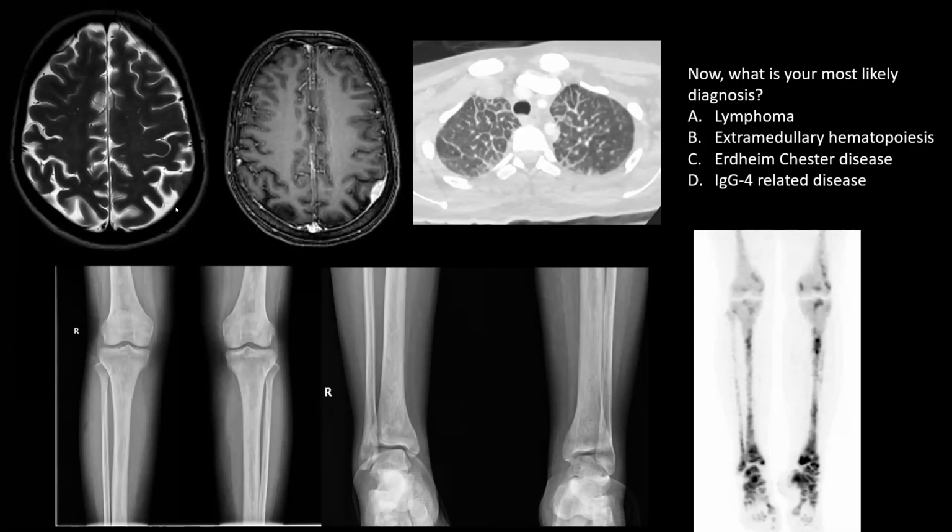And in the brain, we see a meningioma-like appearance of an extraaxial lesion in the left frontoparietal region. And in the lung, we see smooth intra and interlobular septal thickening. In this young patient without a history of cardiac disease, it's less likely to be related to pulmonary edema. So putting it all together, the final diagnosis is likely to be Erdheim-Chester disease.